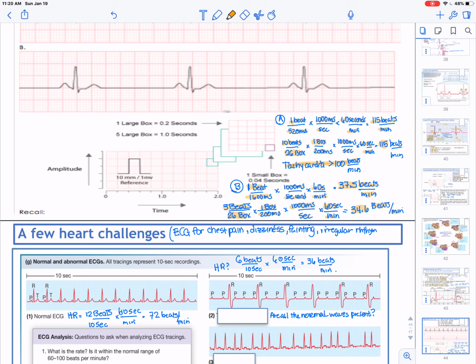So there is a slight difference for B, and I would stretch it, I would say it's within that regular rhythm. But you might say, wait a minute, Dr. Davis, we need to sample more, so we could see if, when we average, we find out that there are slight differences.